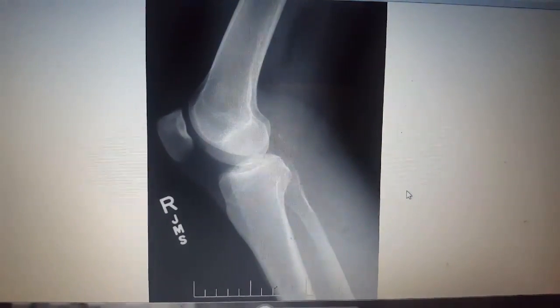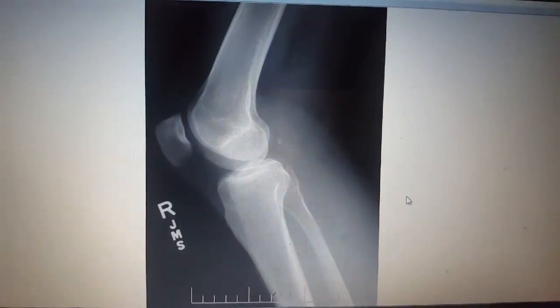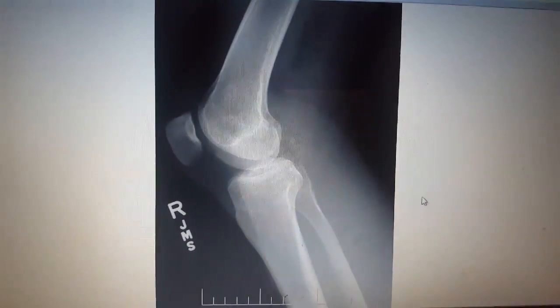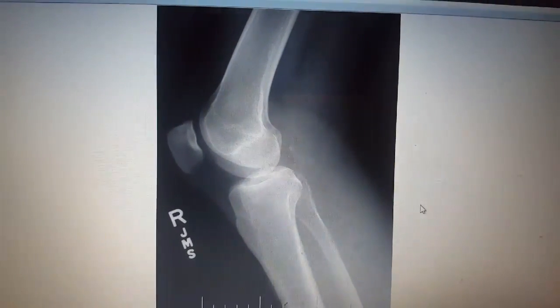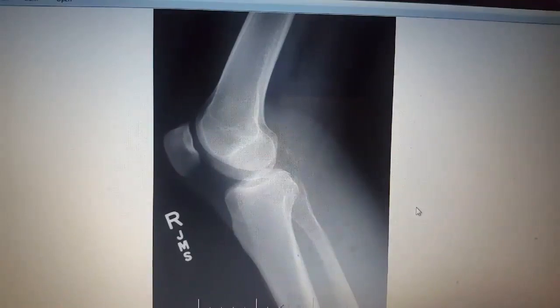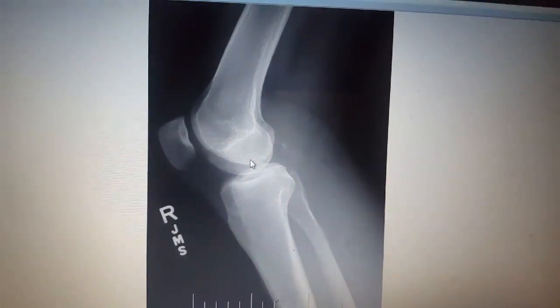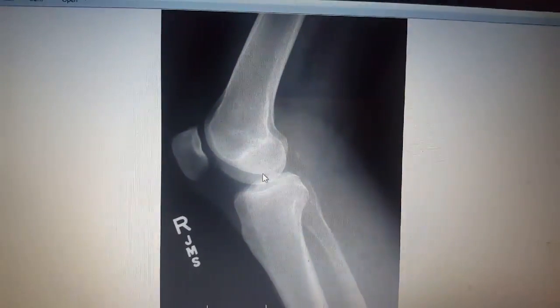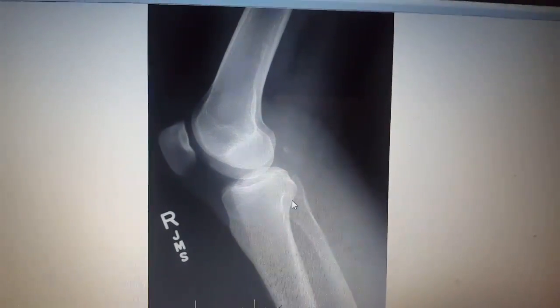The third projection, which was the lateral projection of the knee, the evaluation criteria consists of evidence of proper collimation, also us checking that we actually flexed the knee properly, which was 20 to 30 degrees. And we could check that by demonstrating the femoral condyles superimposed. So here we could see the femoral condyles superimposed. And then also the fibular head and the tibia slightly superimposed, which is down here.